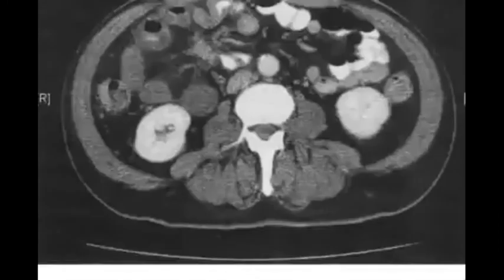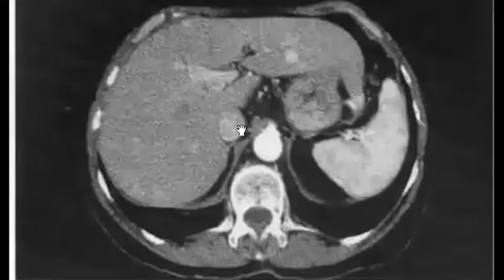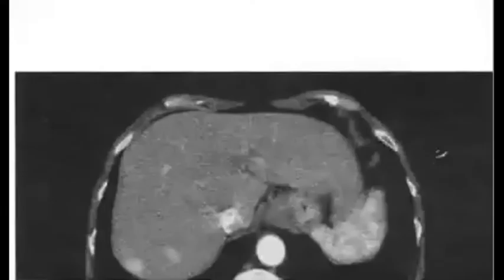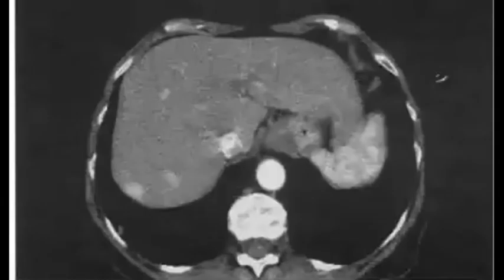So that's what you look for, the arterial phase. And now I think you see this and this and this. So there are multiple lesions in the liver. So you are looking for this metastasis. So now we are talking about small bowel carcinoid with hypervascular liver metastasis. So it is carcinoid syndrome. Exactly, Ala. I agree with you.